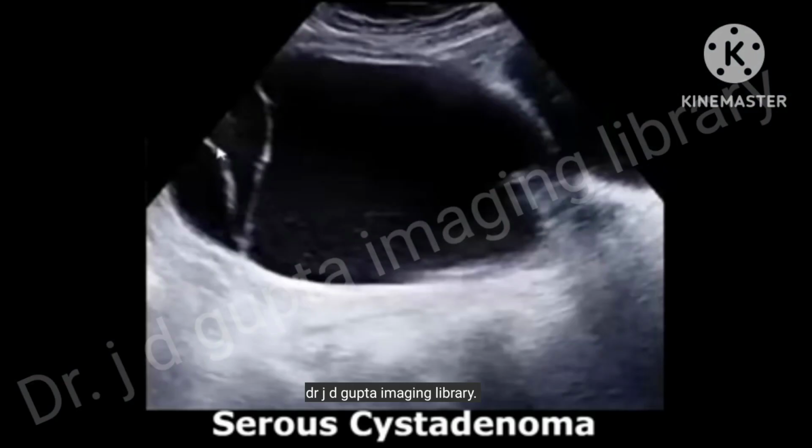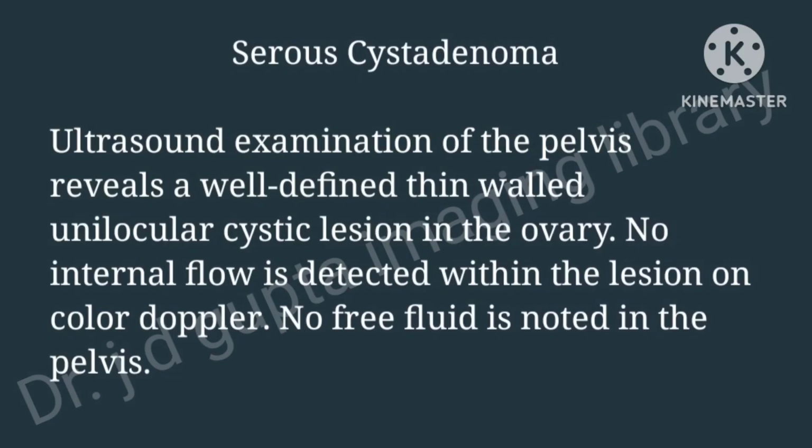Next one talks about serous cystadenoma. Ultrasound examination of the pelvis reveals a well-defined thin-walled unilocular cystic lesion in the ovary. No internal flow is detected within the lesion on color Doppler. No free fluid is noted in the pelvis.